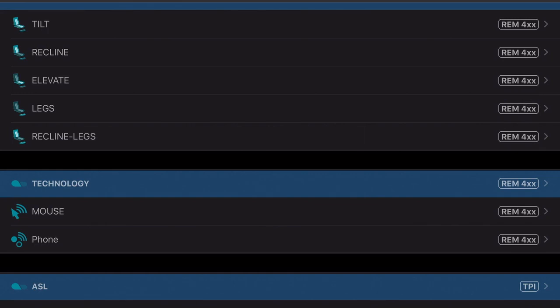You have created a card, we've deleted, we've duplicated, we've moved things. We've done all this work in here, and now it's just how we want it with the patient. What we have to do, down at the very bottom, you see, again, there's a lot of blue, another blue line. It says read and write. You have to write this to the chair, meaning you've got to send it and tell the chair to now look like this.